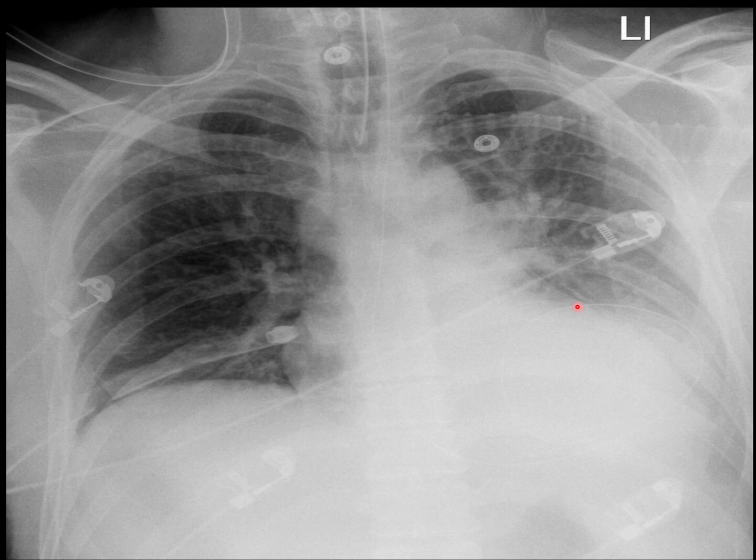So here we have a confirmed left hemidiaphragm rupture. The diagnosis here is: still intubated, and the chest tube is functioning very well on the right side with the two holes inside the chest, but the left side has a left hemidiaphragm rupture, and it was confirmed by passing this nasogastric tube that appeared in the left chest. Okay.